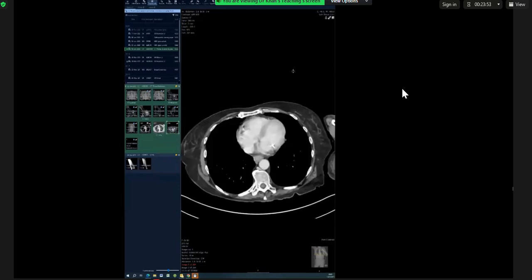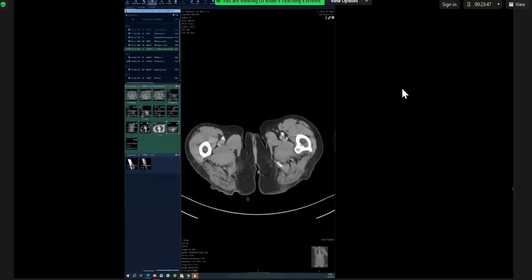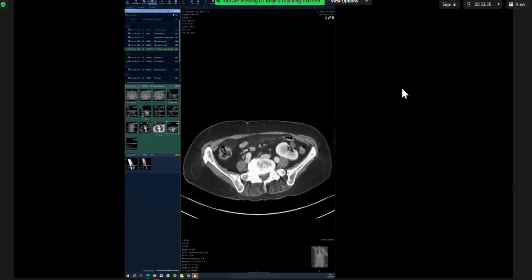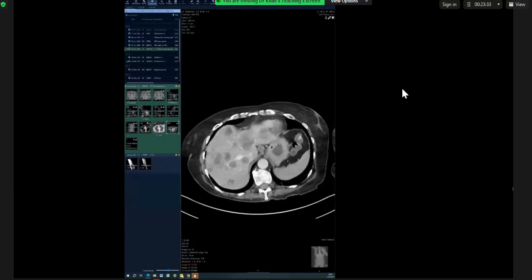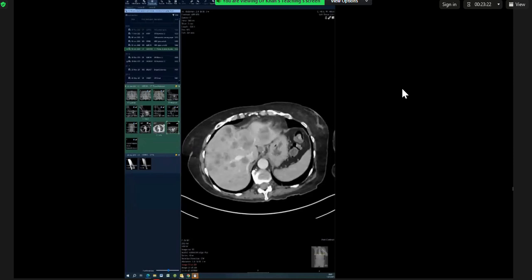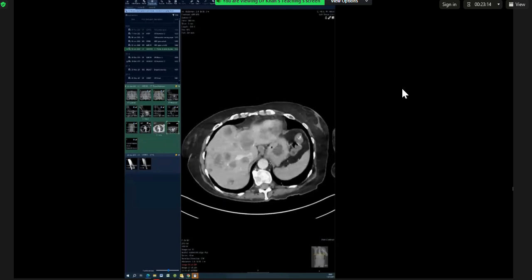So when you have liver lesions but the lungs are normal, you're automatically, rightfully thinking GI tract. So you've said colon. Unless it's a CTC, they're not going to make you look for a very tiny circumferential bowel thickening on a CT. It would be something more obvious. You picked the liver lesion. You did not talk about the necrotic looking nodes right next to it, and that's one. That's two. And you picked the stomach wall thickening. The minute you picked it, you should have noted that there were nodes next to it. And this patient actually did have an esophageal primary with adjacent lymphadenopathy and the liver mets.